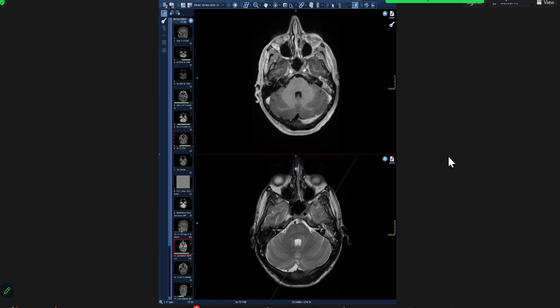So you think it's meningitis. What do you want to do next? I will ask the physician to do the LP for this, and as there is no hydrocephalus, LP can be done. So you're going to tell the doctor that the patient has meningitis, so that they can manage this patient urgently. The patient is sick, right? Yes.